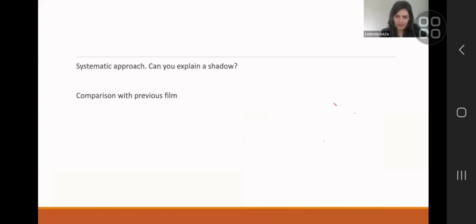The only reason for that is because you don't have previous films. When you report on your trust computer or your hospital system, you have access to patients' whole life behind you in most places. And now the PACS are going back 2 decades at least. So the most important film in any patient's history is the previous film, not the current film. The minute you open an X-ray and you think, oh my, that's abnormal, you open the previous and it's there, or slightly different, or no different. You've reported that X-ray in 10 seconds.